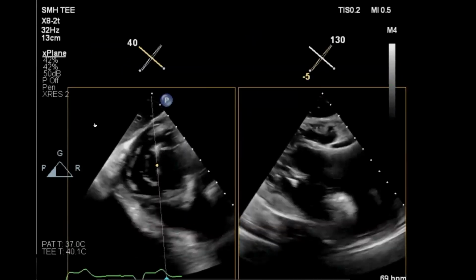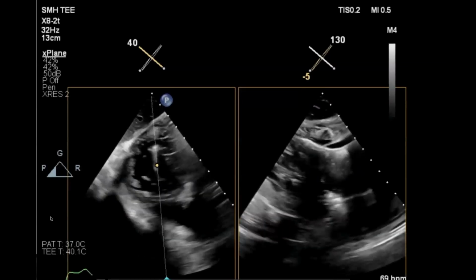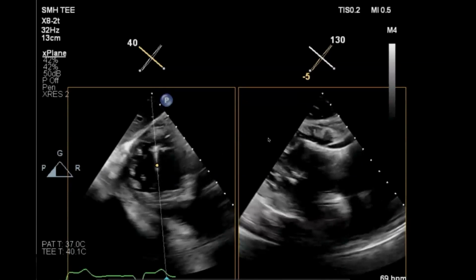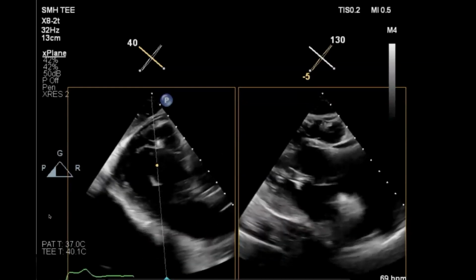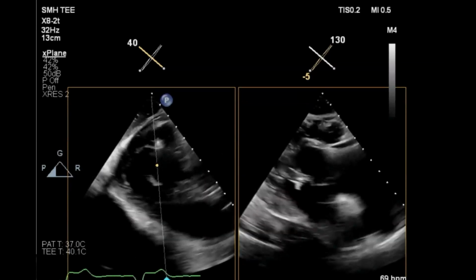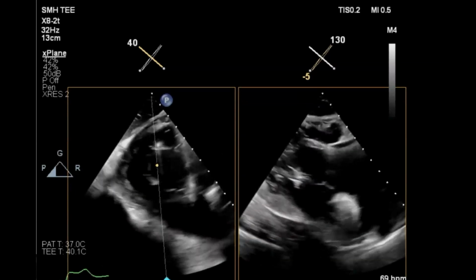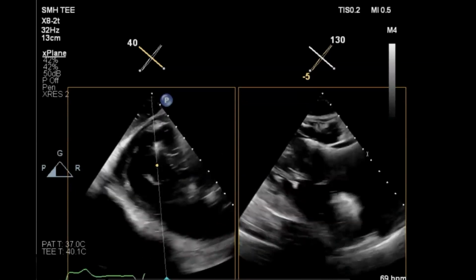As we explain, again, directly through the lead, here's what we see. Very, very interesting. It courses posteriorly, but you can also notice that the posterior leaflet here is completely fixed. It looks frozen. It looks stuck to the lead. Even the lead's got this strange bend to it. It's bending back. It's got this kind of S shape almost.